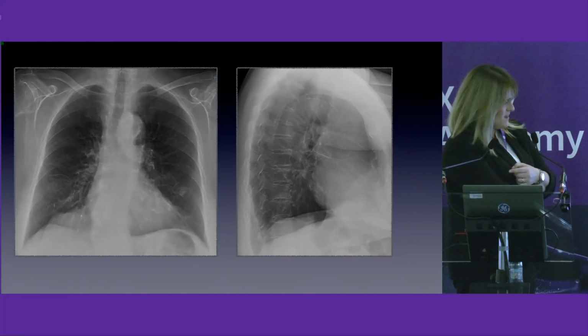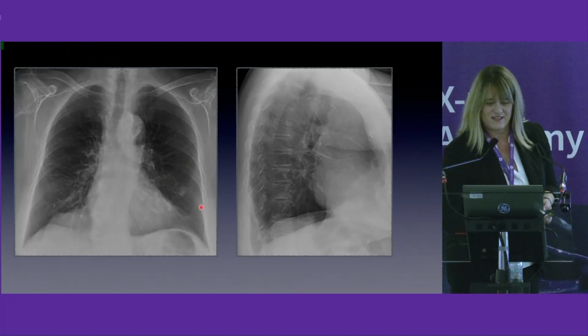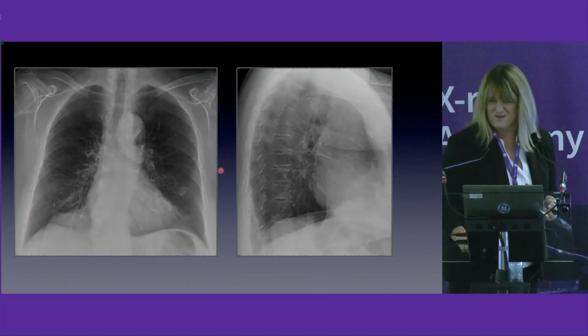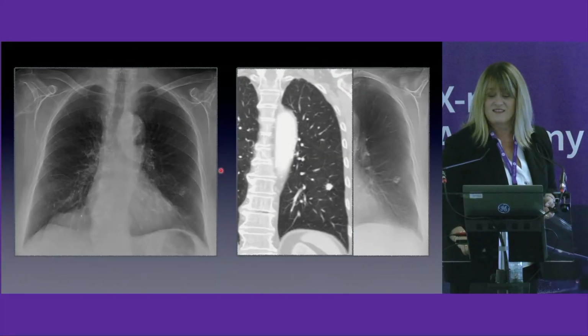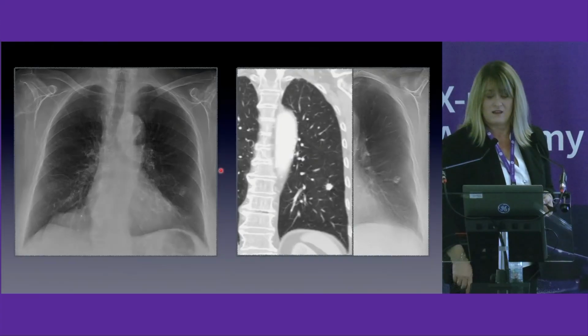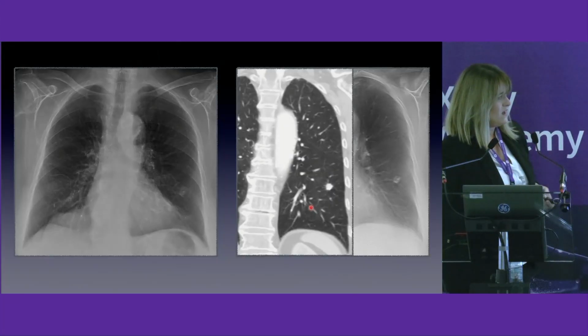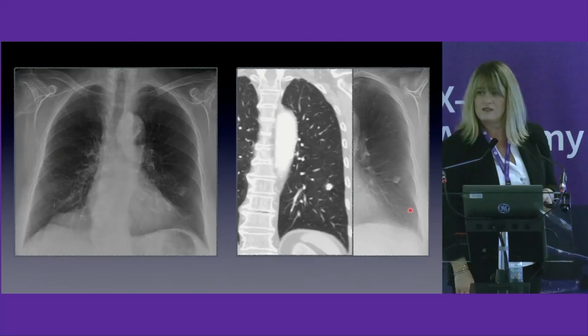Okay. That's perfect. I think you mean this. Correct. We can perform DTS. Why not? And that's a true lung nodule. Please compare chest X-ray with DTS and CT scan. How easy is it to recognize this nodule on DTS?